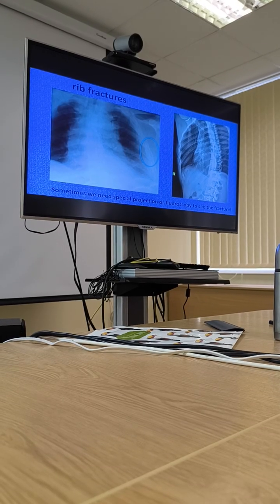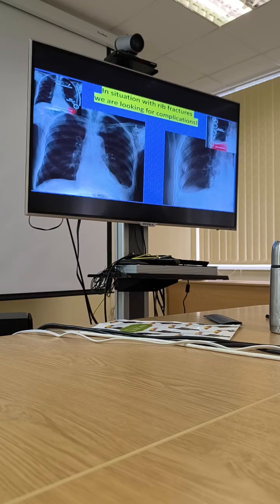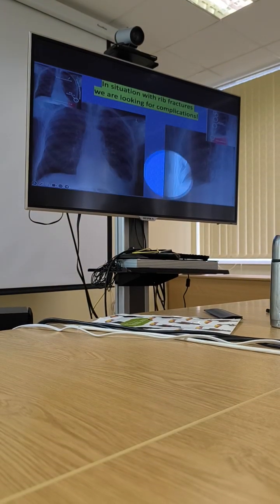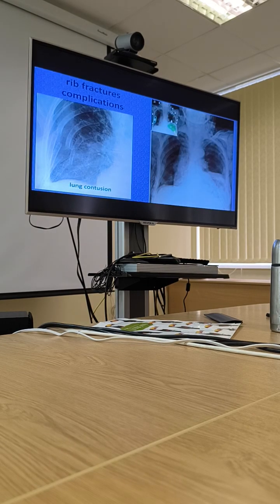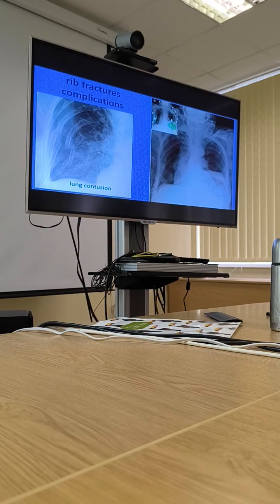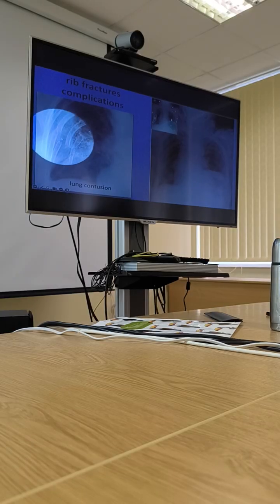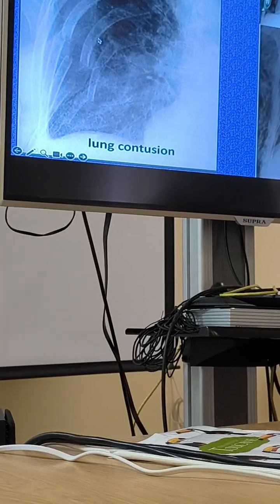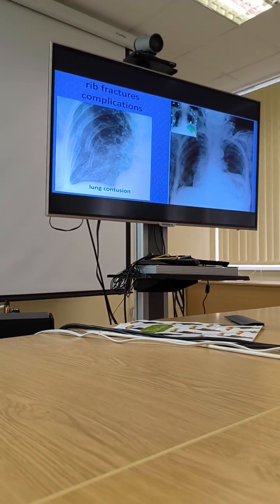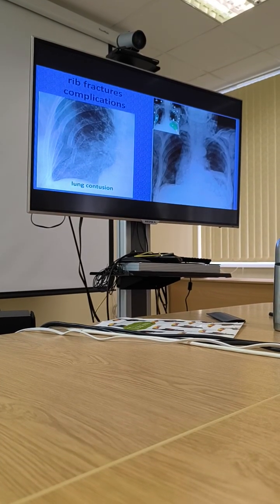But then pay attention to collections inside the lung and inside the pleural cavity. So let's see, what do we see there? First of all, we see hemothorax. Remember hydrothorax? These are the same thing. In this situation, that is what we name lung contusion. That means that since the patient has several rib fractures, blood is collecting inside lung tissue. This is important to see and to do something about.